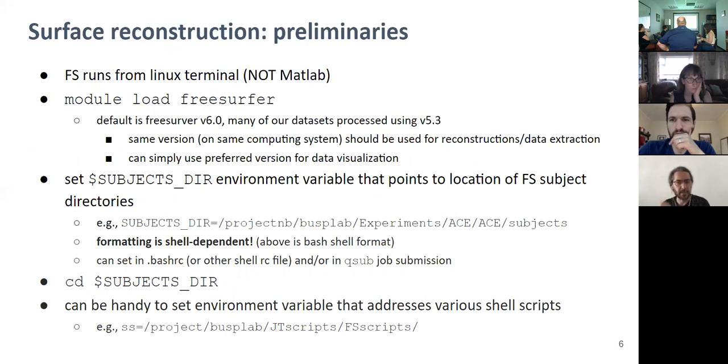Right. If you are using it from the command line, you don't need the export because you are already in the base variable space. But if you are within a file and you are going to run it with something like bash and then the name of the file, then it's going to have its own bash space to create the variables and everything. And you want to refer to the base space variable, and that's what you use export for. Or at least as far as I recall. I might be wrong about this. Yeah, that makes sense because I think I took it from an old QSub file that I had. Because in there, I would need to do it, but I don't have it in the bash file.